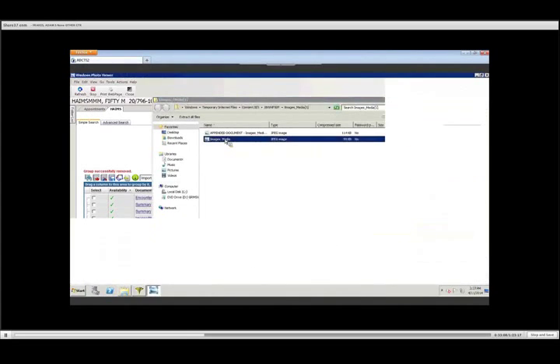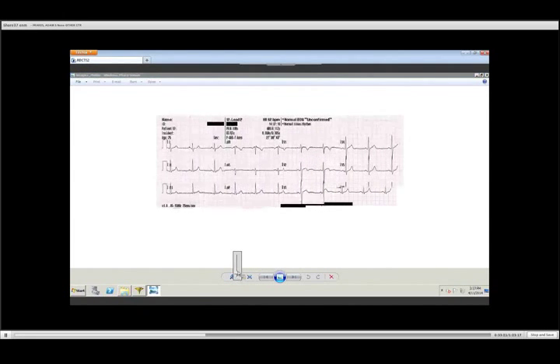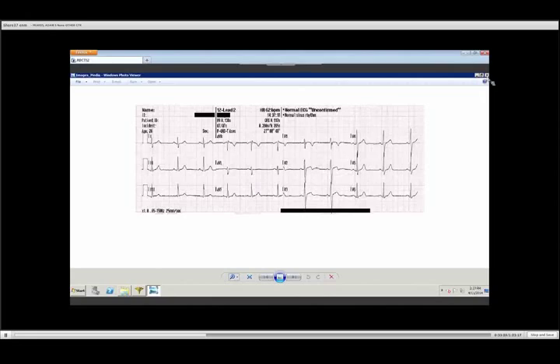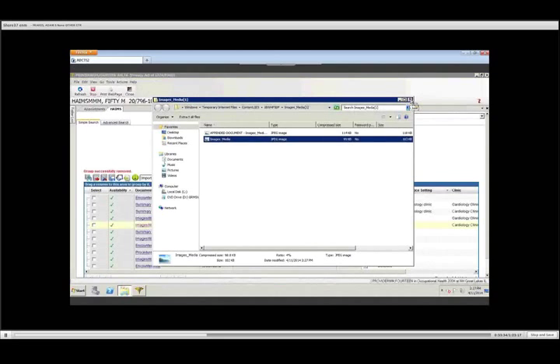And as you can see, we have an EKG in color. Full screen, full size. Of course, I've opened it with my Windows photo viewer, so I do have the ability, if I choose, to enlarge it. Very easy to see full-size documents from within HAIMS. And there really is no size limitation for the file that you are going to import.